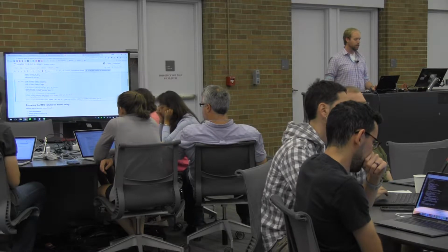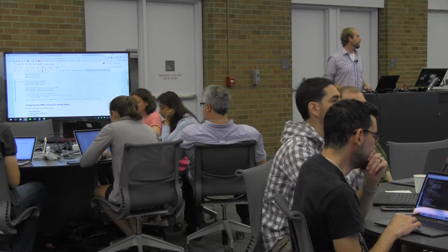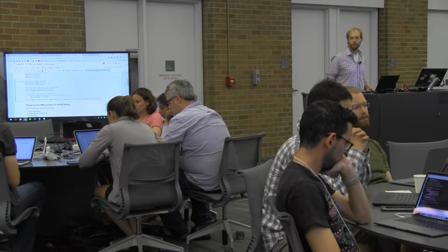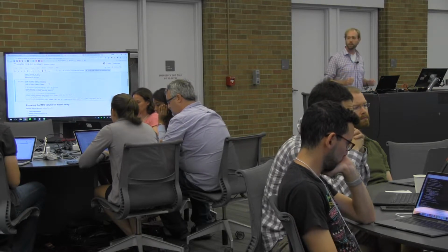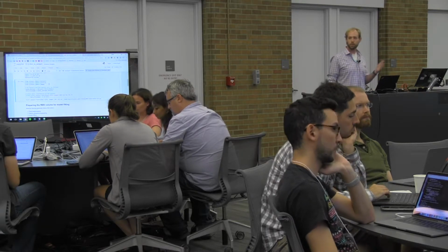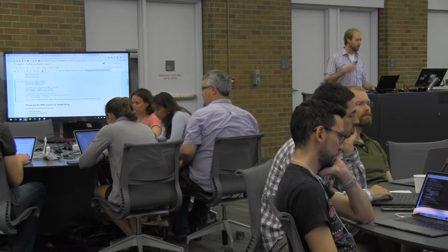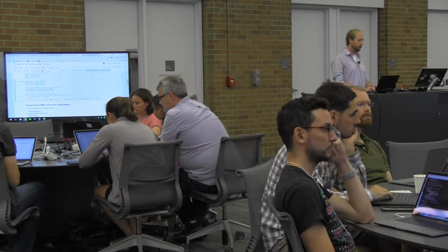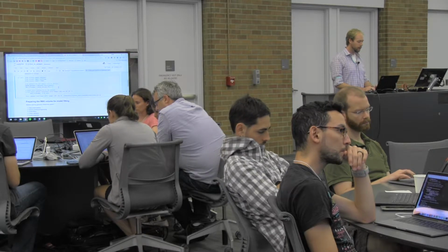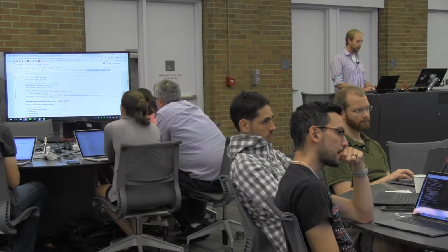This is the Haxby decoding data set, and I'll go into it in a little bit more detail in the next notebook. But effectively, it was a task in which subjects were looking at, I believe, images of different kinds of objects. It was cats and faces and houses and stuff like that. And what they were trying to do is determine if they could decode the kind of object that a person was looking at just using the voxel activity in the brain. And this is going to be the decoding example that we go through in a little bit more detail next. So here we're just going to fetch the Haxby dataset. We can see that it's downloaded this nifti file and saved it onto the disk.